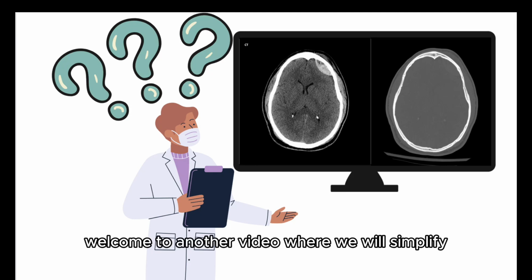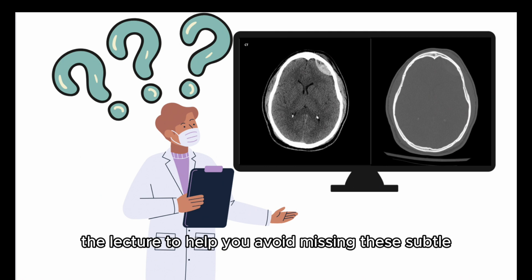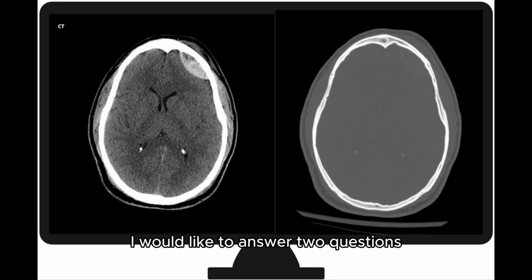Welcome to another video where we will simplify the approach to CT brain hemorrhage. I will also add 2 tips at the end of the lecture to help you avoid missing these subtle bleeds in the brain. In order to simplify this approach, I would like to answer 2 questions.